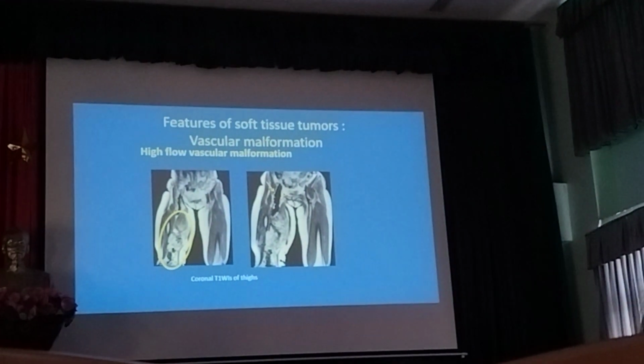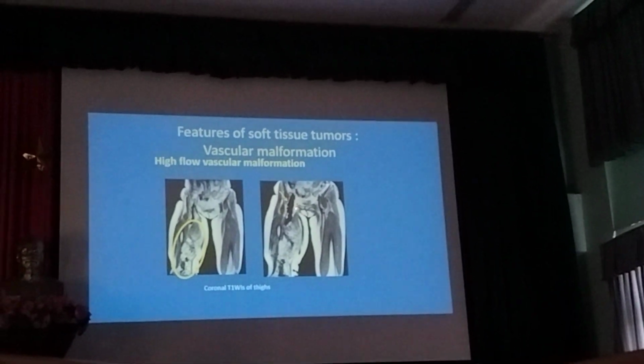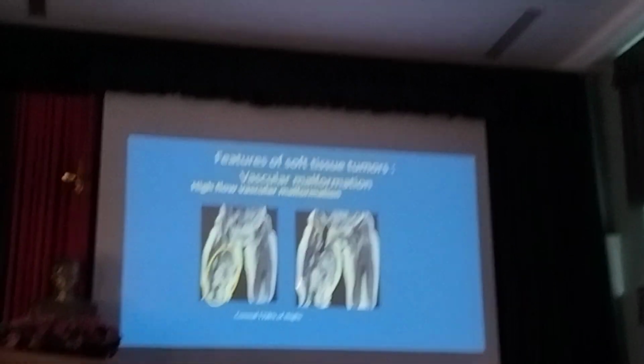So the key findings we'll see, you can see the large vessel go into this mass.